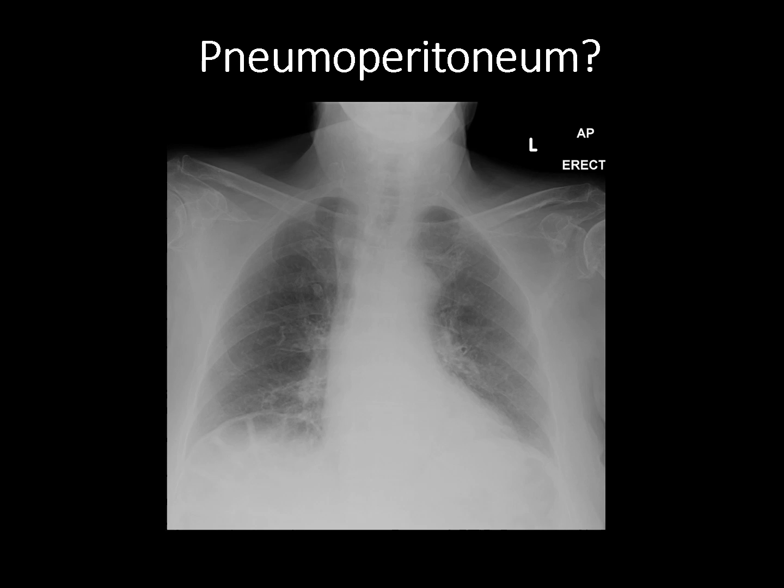So is this pneumoperitoneum? And I included this just to make another point where not everything that's lucency under the diaphragm is always pneumoperitoneum. It's important to look closely and see, is this a bowel loop? Do you think this is the stomach bubble, etc.? So in this case, we can see clear haustra, these folds within the bowel. We can even see a little bit of a contour change as these folds press against the diaphragm. So really this is just a loop of large bowel interposed between the liver and the diaphragm with gas within the bowel loop. So there's no evidence of pneumoperitoneum on this image.